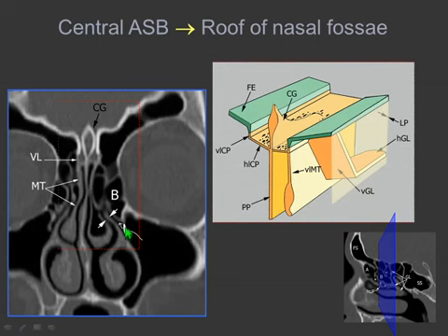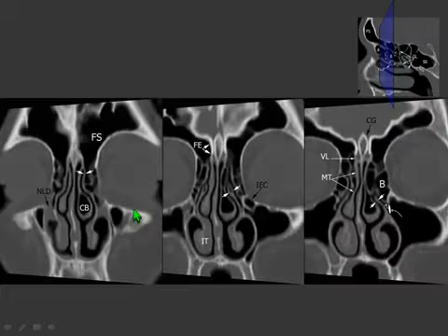This area is the ostium of the sinus, and from the ostium the mucus will follow a very narrow path, which is the infundibulum, and the infundibulum is dictated by the bulla, its floor, and by the uncinate process. And this is the key to understand how the mucus will be removed from the maxillary sinus.